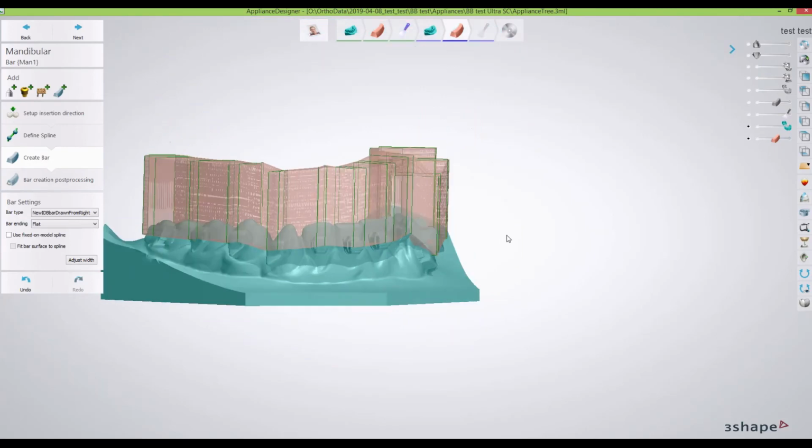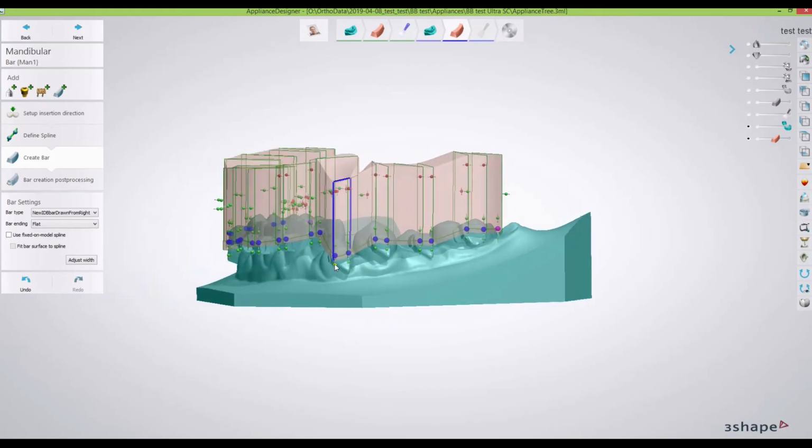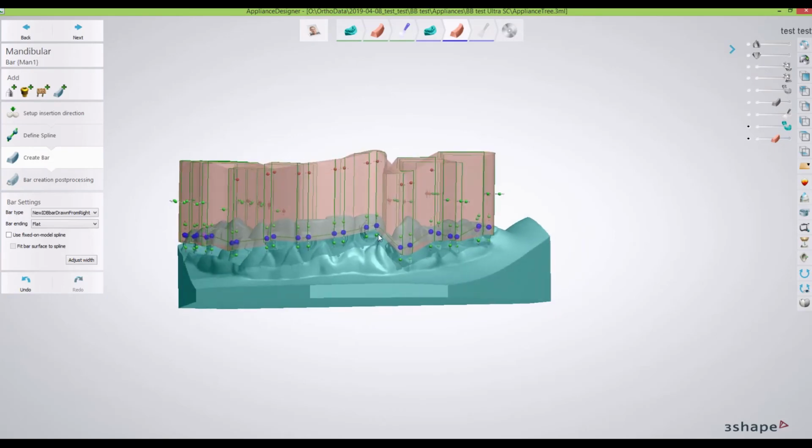And then look at the height of your tray. Sometimes on the lower, it seems like it goes a little bit higher than what I actually chose, so I think I need to move my points down. It seems like on the bottom is where I'm constantly dropping these down just a little bit in the posterior. And again, when you have areas of crowding, you may find that you want to bulk them up a little bit for that rigidity. One thing that has surprised me is we're able to print these as one piece, and we're able to seat them as one piece too.